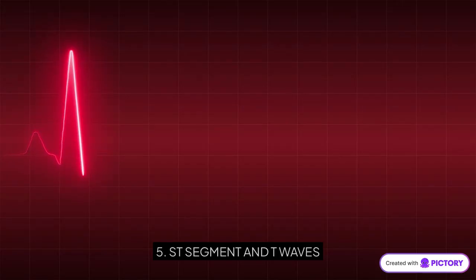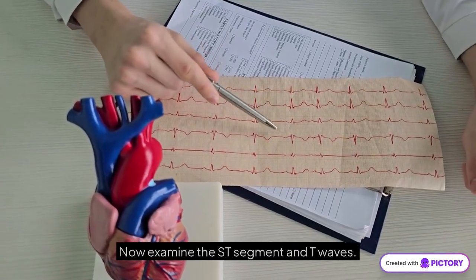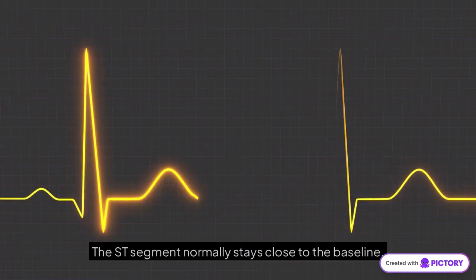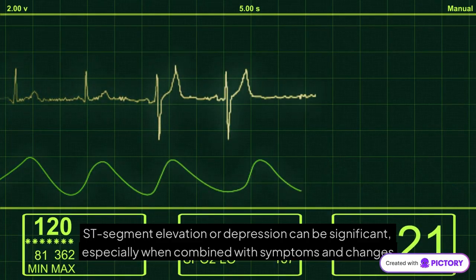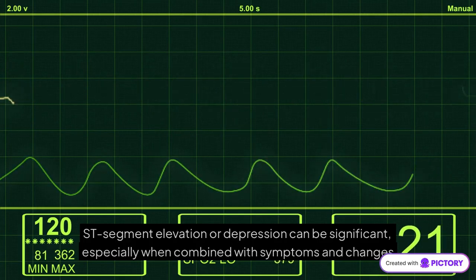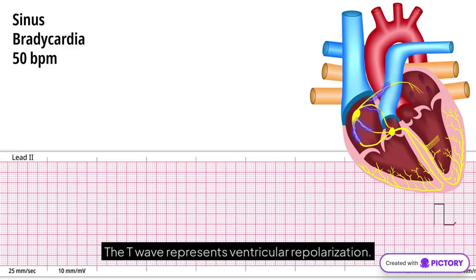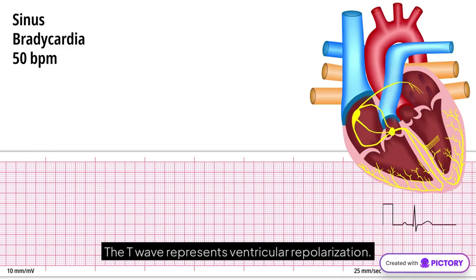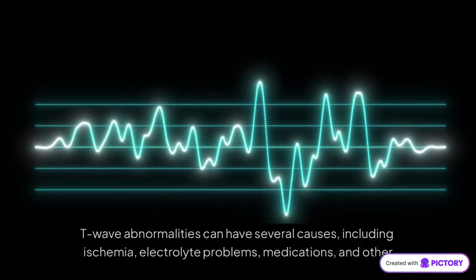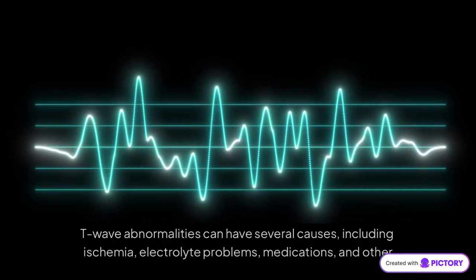5. ST segment and T waves. Now examine the ST segment and T waves. The ST segment normally stays close to the baseline. ST segment elevation or depression can be significant, especially when combined with symptoms and changes in specific ECG leads. The T wave represents ventricular repolarization. T wave abnormalities can have several causes, including ischemia, electrolyte problems, medications, and other heart conditions.